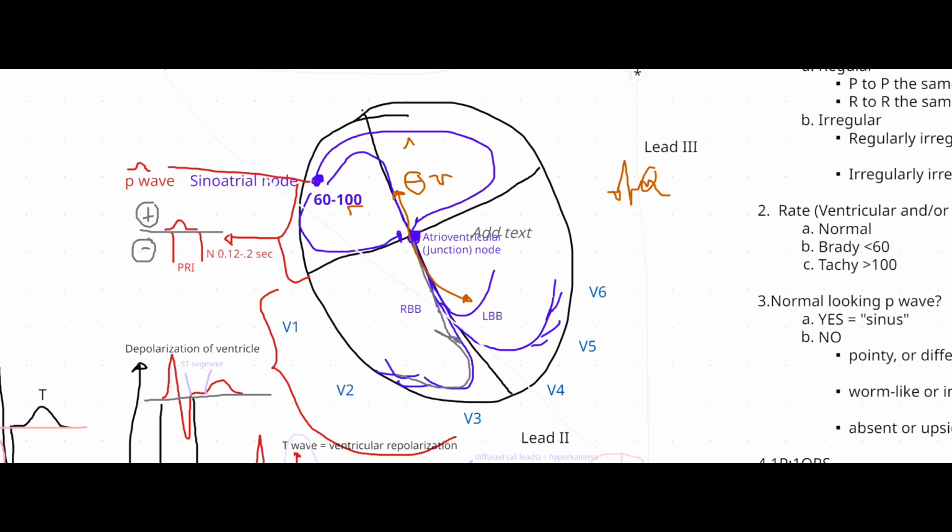And then if your Purkinje or your bundle branch have to pick up, then that rate is going to be less than 40, right? The lower it is in the conduction system, the lower the rate. Because it's coming from 100 down, down, down.